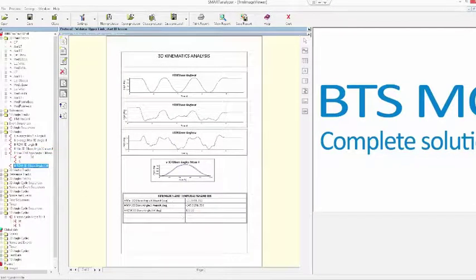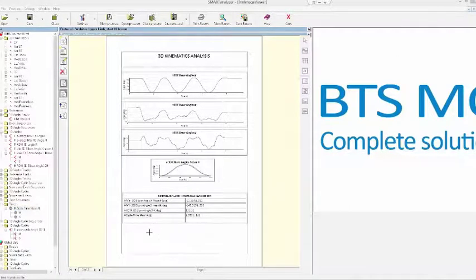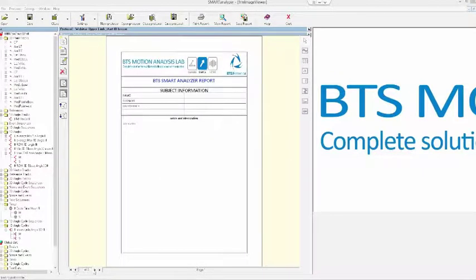Okay, so as you can see, to add a variable into a table, you have just to drag and drop the variable into the second row of the table. Now I want also to add the cycle time. Okay, and that's it. And also in this case, imagine that we want to have a legend, for example, below the pages. Okay, so now we have created 3 pages.